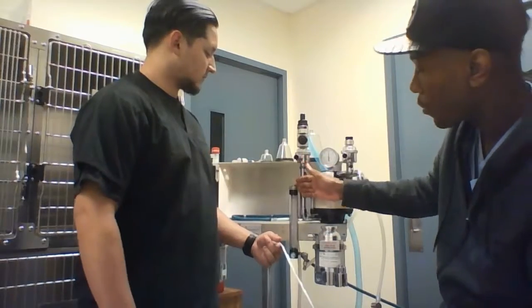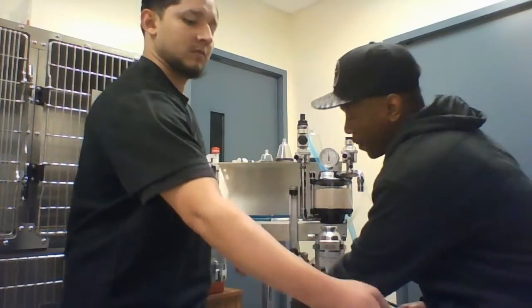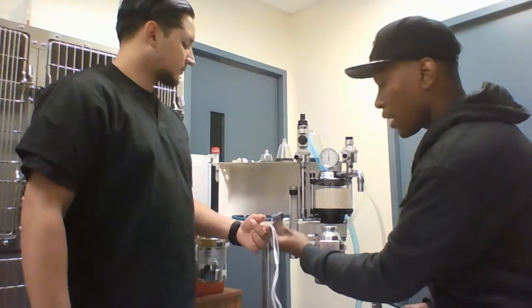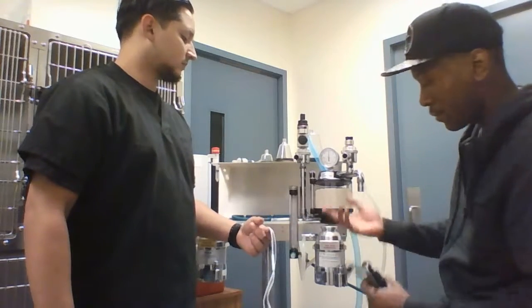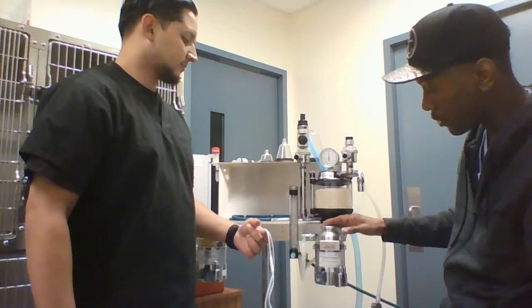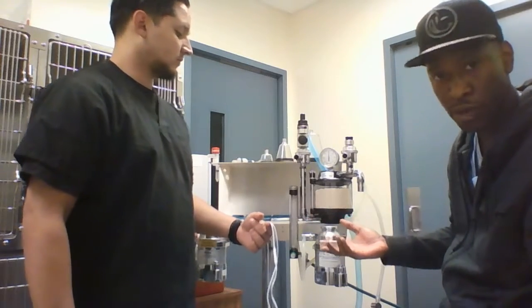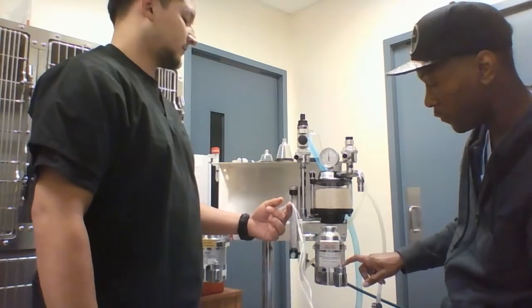First we have the flow meter, which measures our gas in liters per minute. It also indicates how much oxygen is being administered to our patient. The oxygen will travel through the flow meter to the vaporizer, through the vaporizer inlet valve. And as described in the rebreathing circuit, the vaporizer has an indicating knob along with a safety latch to prevent personnel from being exposed to isoflurane, along with the indicator window and the fill port.